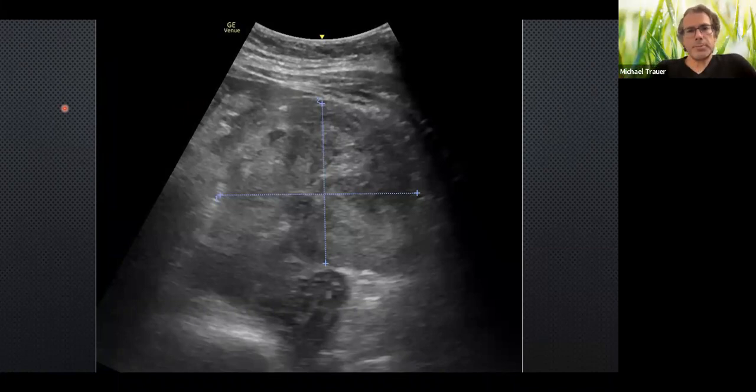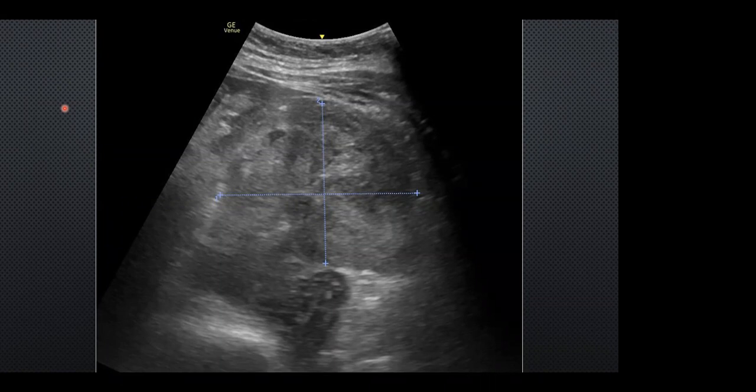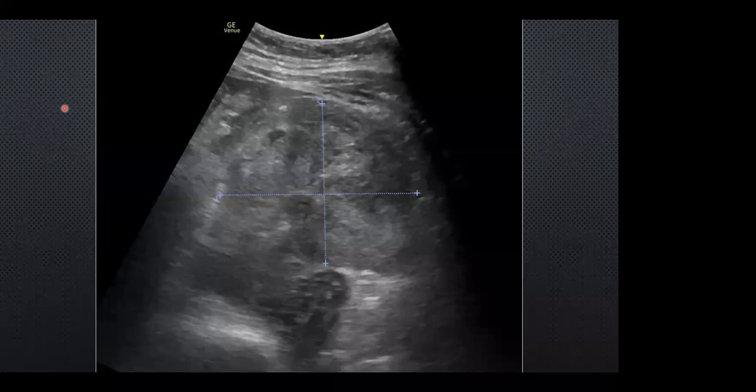Any comments on this image? You don't have to necessarily say what it is, but you can describe what it looks like in ultrasonographic terms. How old was this patient, Michael? 24, one week post renal biopsy. Biopsy was on the left side, pain's on the left side, and this is just below the left kidney in the left iliac fossa. Okay, that looks like an inhomogeneous mass of different densities, suggestive of a possible bleed in this context.